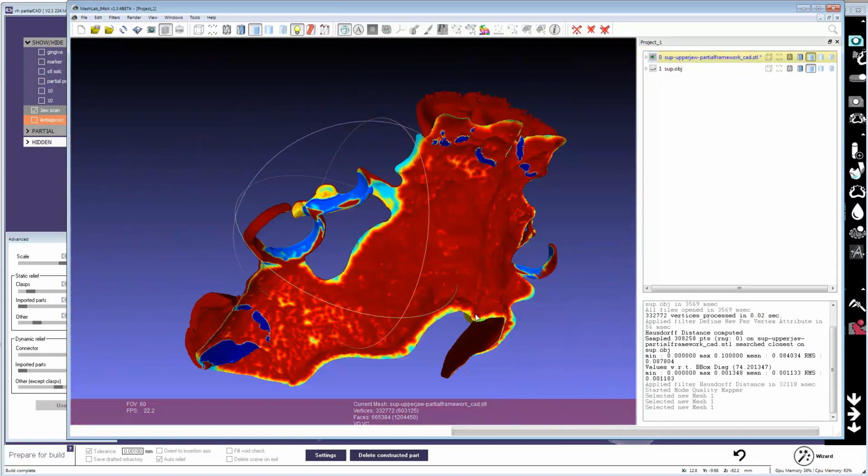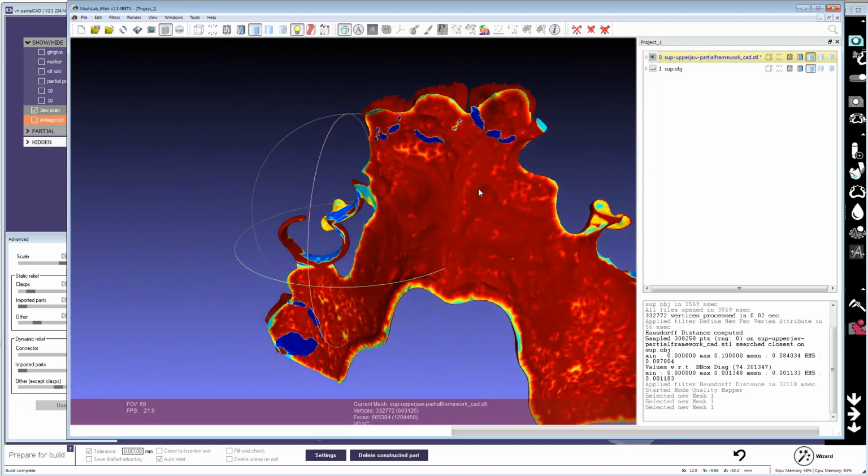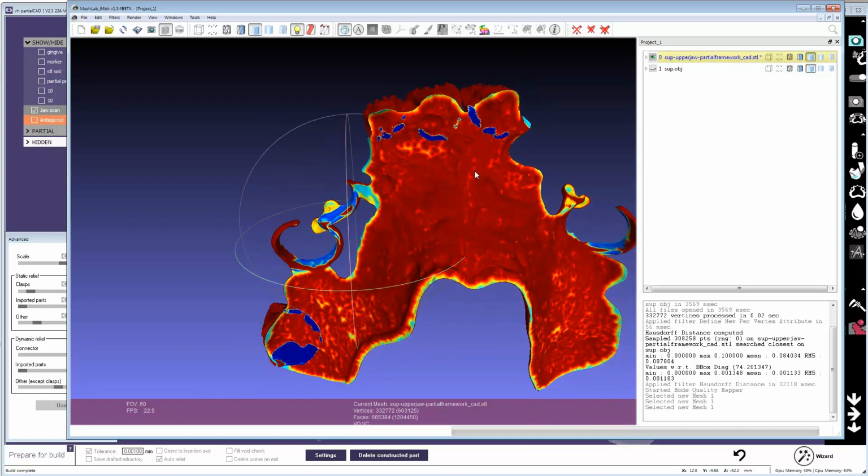Now the other thing, in general, you can say this is probably too much offset for the major connector. Most people don't notice this or complain about it, which I'm actually surprised about, but it seems to be fine. But if you want less offset in your major connector, I can show you how to do that.